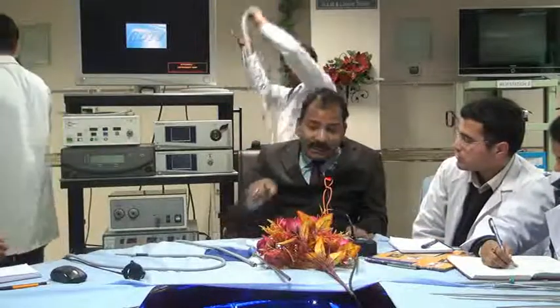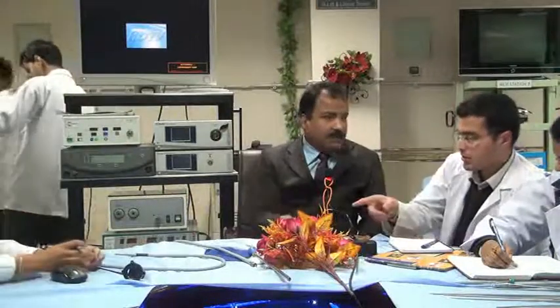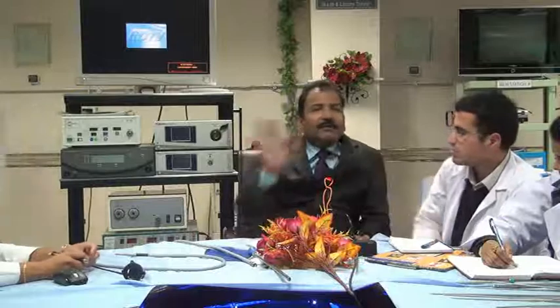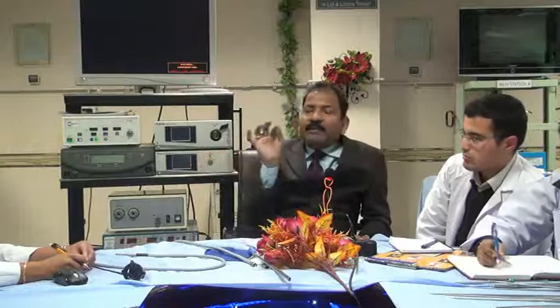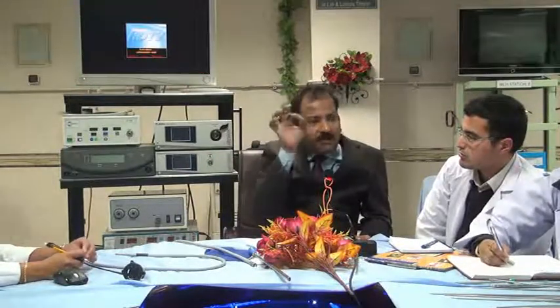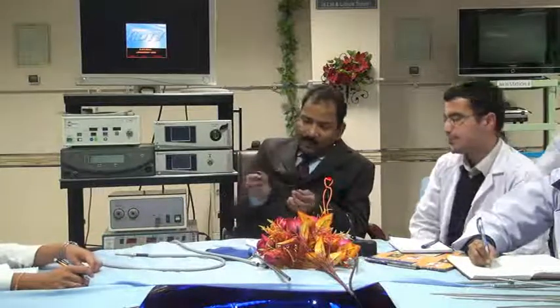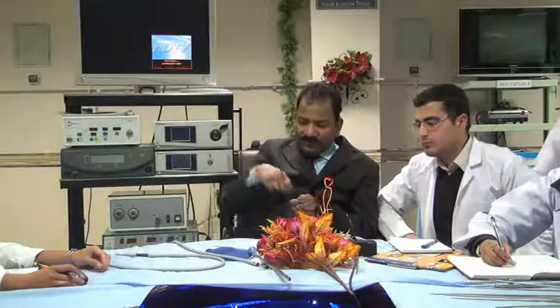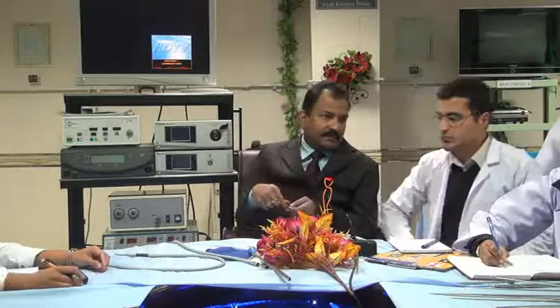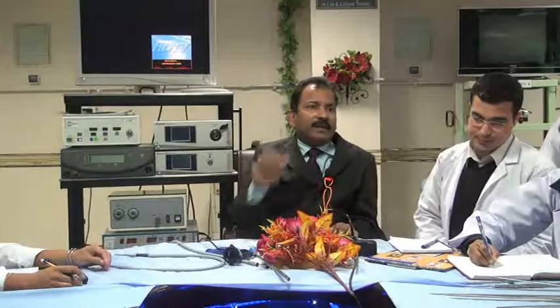In light cable also there, and in telescope also there. In camera cable there is no fiber optic. There are wires. In camera cable, the light which drops over the CCD, the photon will make electron. And in this camera cable, if you see, this is simple wire. Yes, this is wire. This is electrical wire. This is simple electrical wire. If you break it, there will be wire inside. So it doesn't have fiber optic.